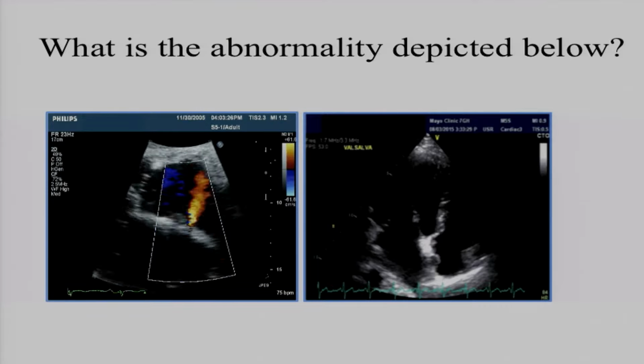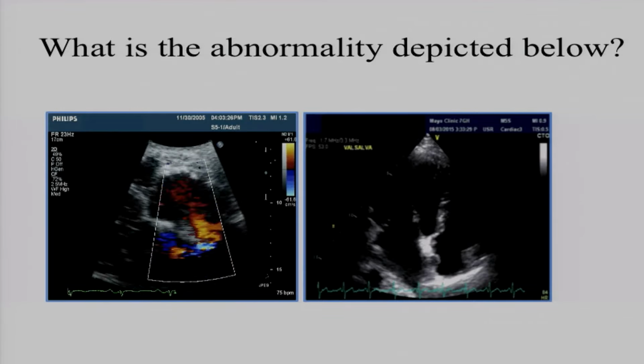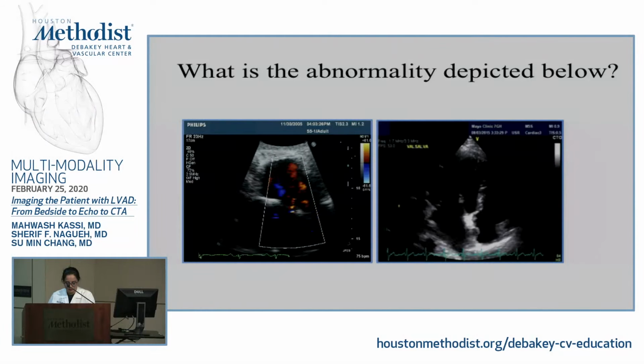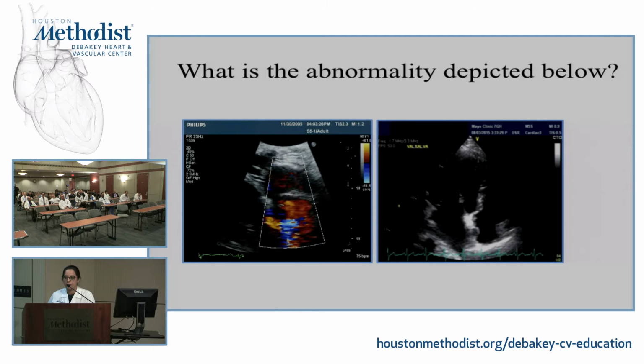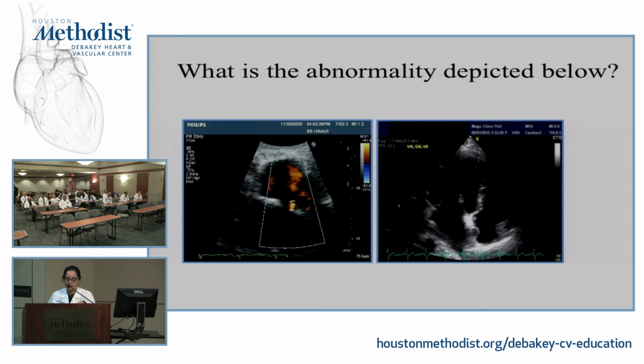This is where a patient suddenly got hypoxic after they were placed on LVAD. Does anyone know what that is? Yeah. So that can happen after they, again, images are not always the greatest in the initial perioperative phase, but there's somebody who got hypoxic right after an LVAD was placed. So suddenly you have LA pressure that goes down a lot, and now you have a PFO that opened up and the patient gets hypoxic. And this, in my limited experience, I've seen it 4 times now already.